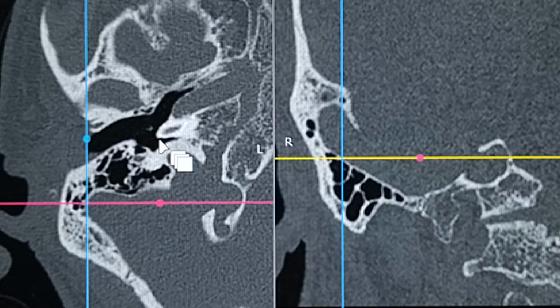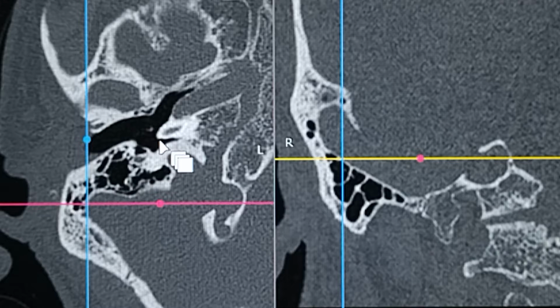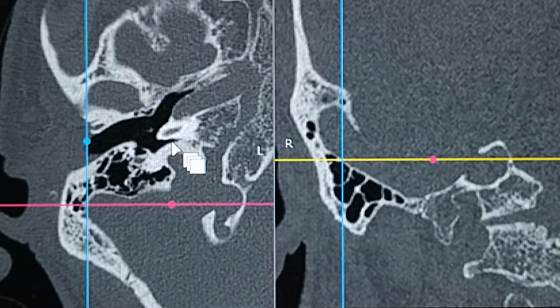That's the promontory basically. And we all know the second structure, which is just lying posterior to the promontory, is the round window. You can see something over here, the blackish structure, that is basically the round window, which eventually connects to the basal turn of the cochlea.